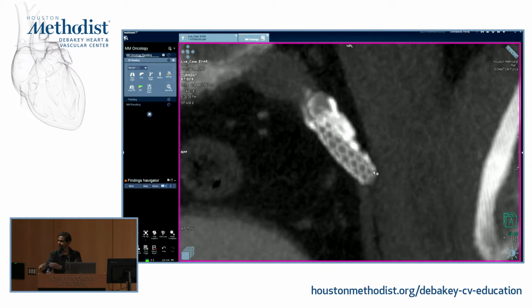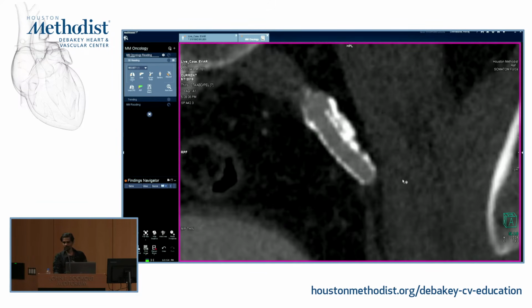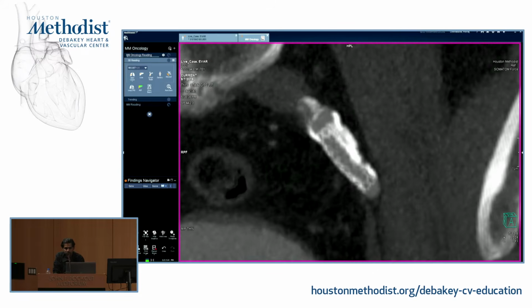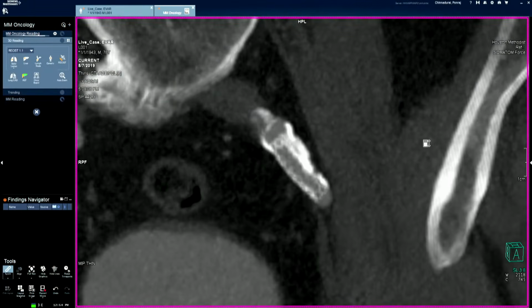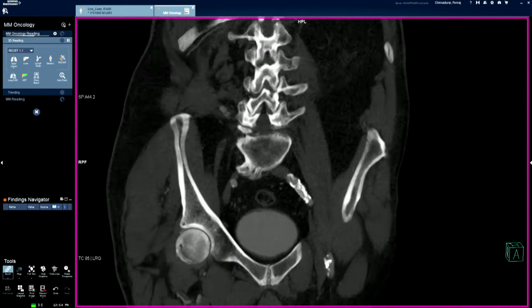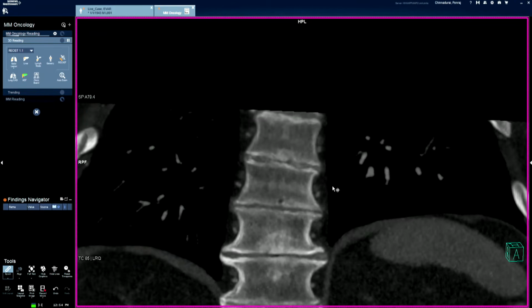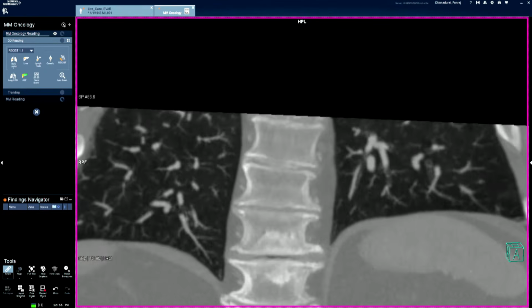So, but I'm going to play dumb, because I am. So maximum intensity projection as opposed to minimum intensity projection. So what's the maximum intensity part? Okay. Stacking the image. So what it is doing is, if I give you an example, let me start this. So for example, if I change the same, maybe I should go towards the, so we have some part of the lung here. So we looked at in our Hounsfield unit scale, air is, wow, very good. Thank you.